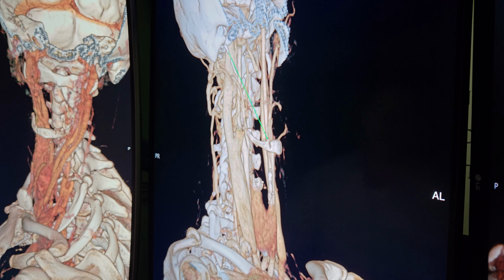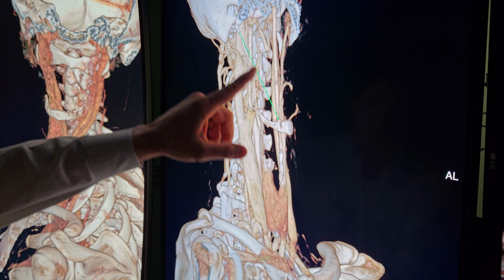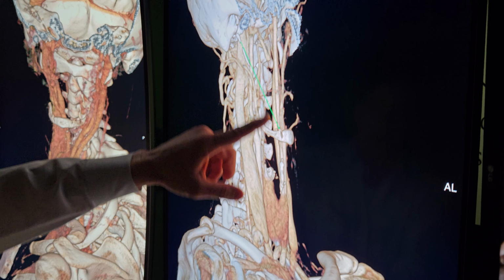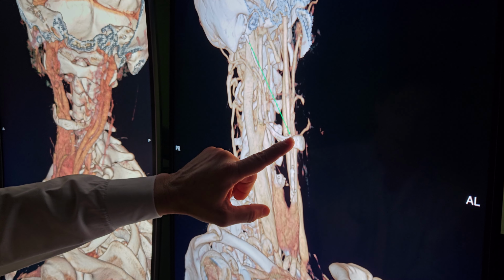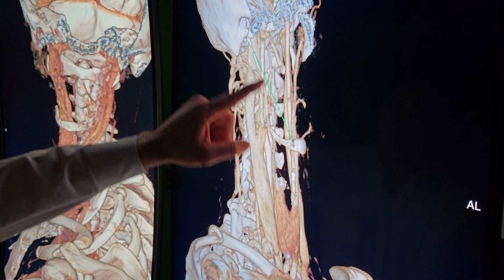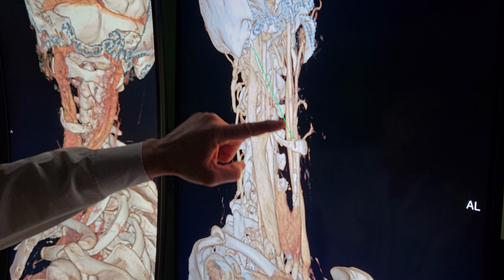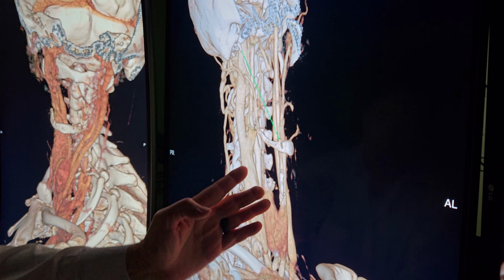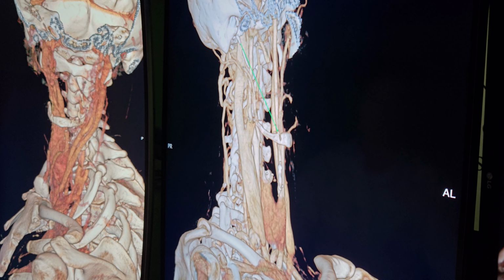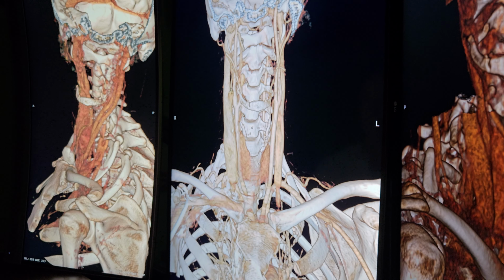So it seems as though, and there's other evidence I can show you elsewhere in the neck, that she had a nasty whiplash or some injury in here. And this ligament, the stylohyoid ligament that goes from this horn of the hyoid to the styloid, was injured. We can see it starting to calcify through here, and I believe it's contracted and making this hyoid closer, and it's not midline anymore. So let's speak to the contractures that we found in the neck.